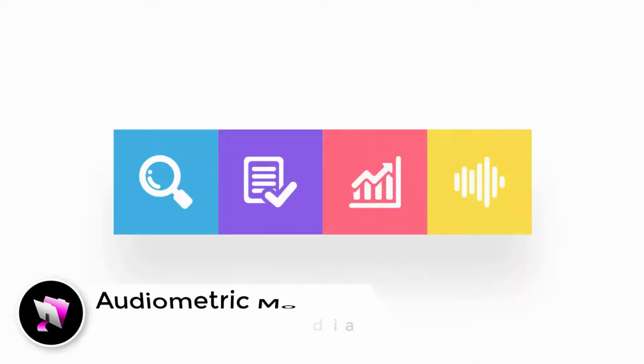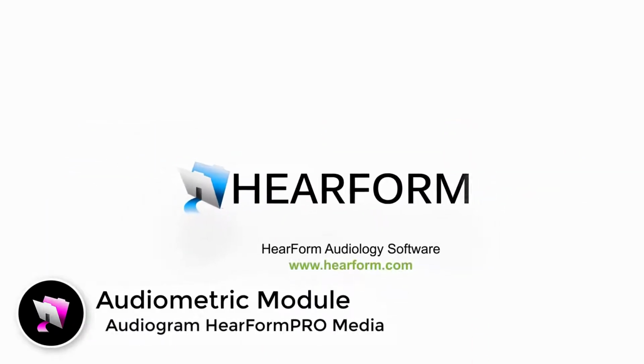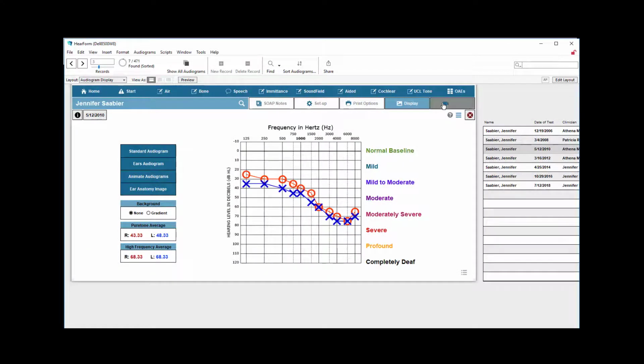Welcome back. This video will explain the Audiogram HearForm Media option screen. Let's head over to the Media area in the Audiogram module.